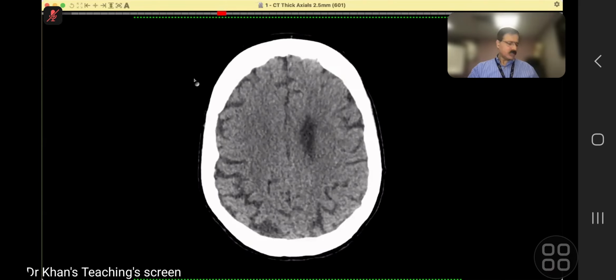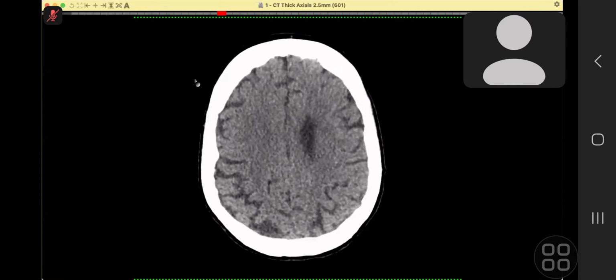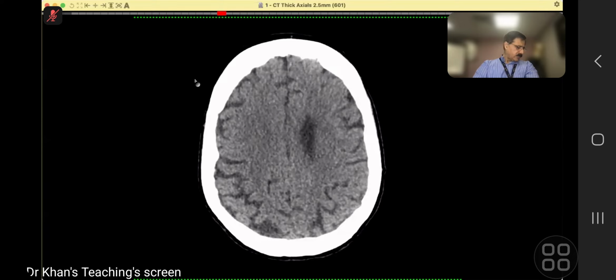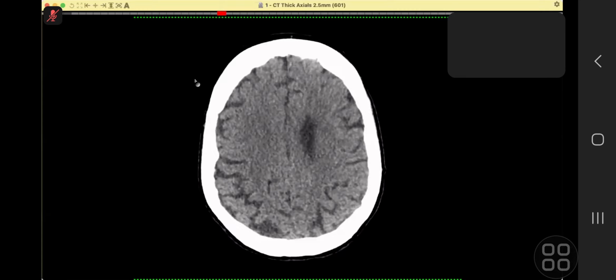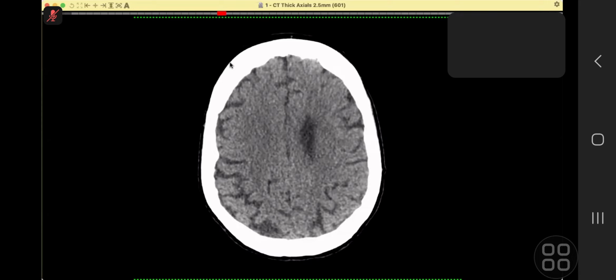Okay, candidate 2, are you with us? Yes, sir. Now, this is a 81-year-old female, A&E case, loss of consciousness in lounge, so not a road traffic accident, hit her head. So the patient also is on anticoagulants. So they want to rule out intracranial hemorrhage. Simple as that. Over to you. Okay, sir. I'll just request the remote.